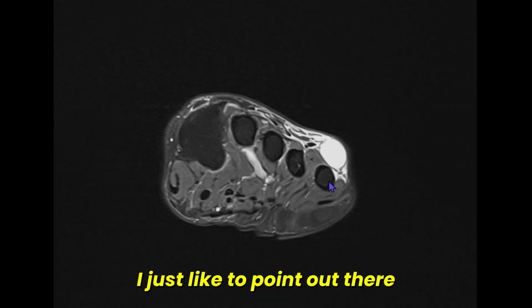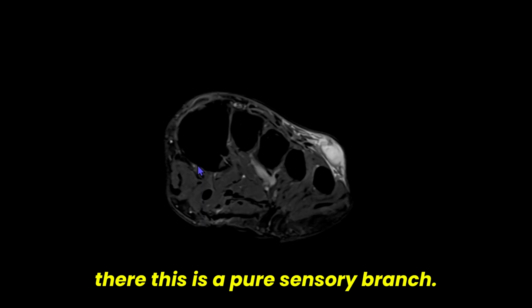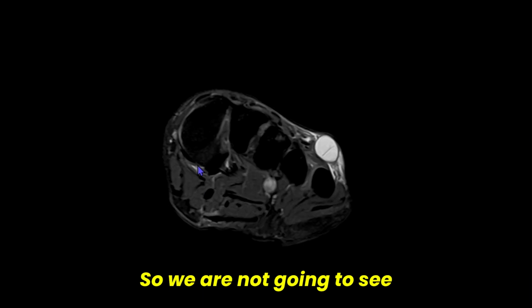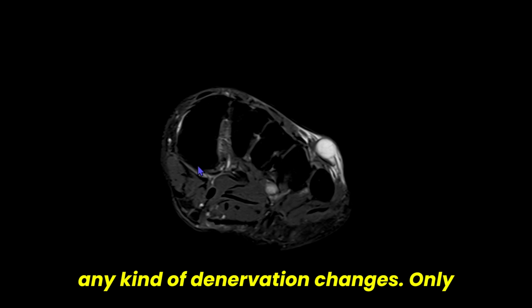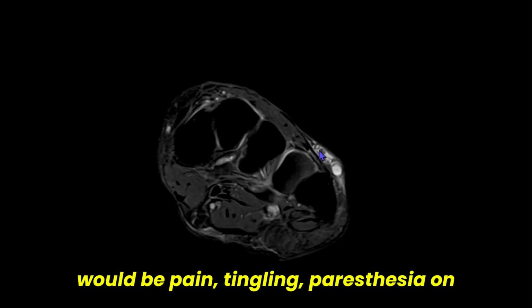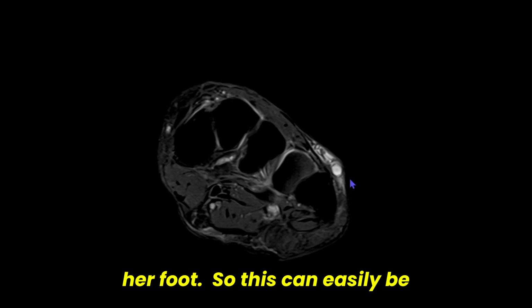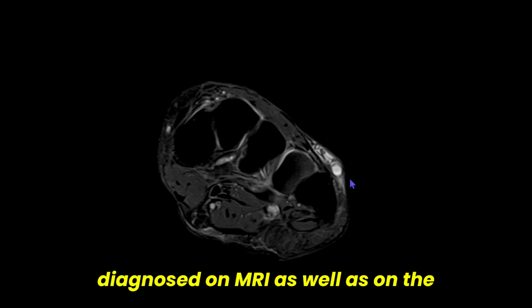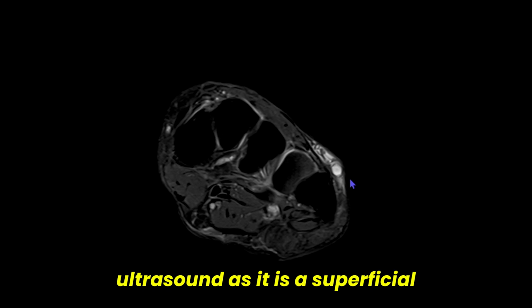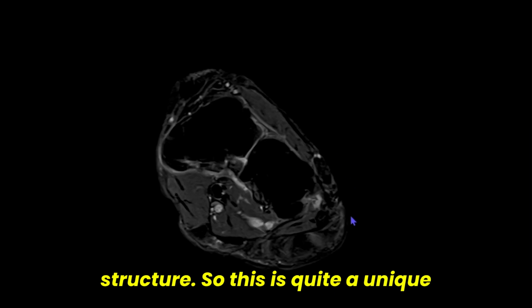Now I'd just like to point out that this is a pure sensory branch, so we are not going to see any kind of denervation changes. The only changes that the patient would experience would be pain, tingling, paresthesia on the lateral aspect on the dorsum of her foot. So this can easily be diagnosed on MRI as well as on ultrasound, as it is a superficial structure. So this is quite a unique diagnosis.